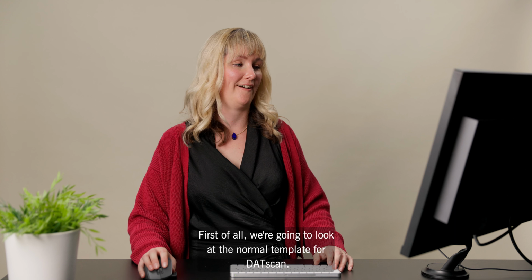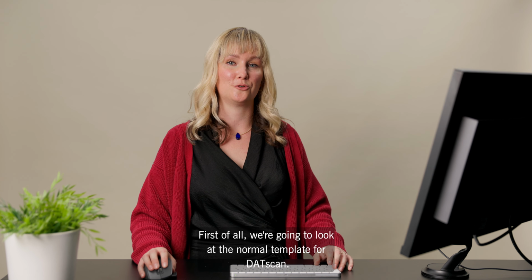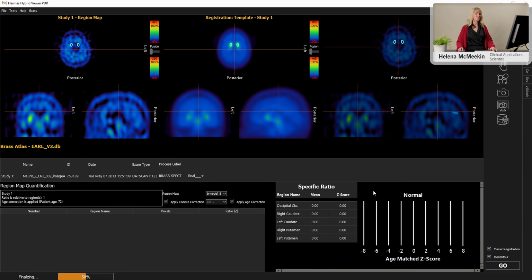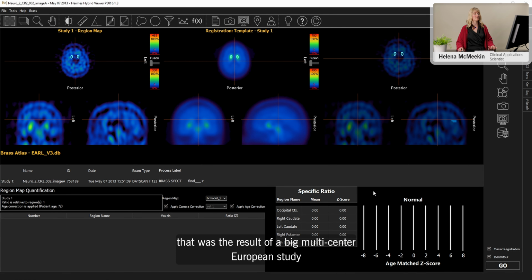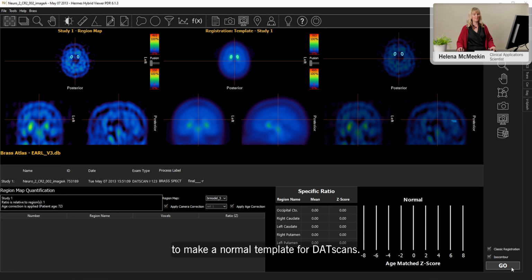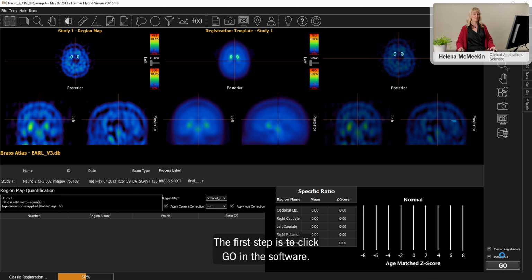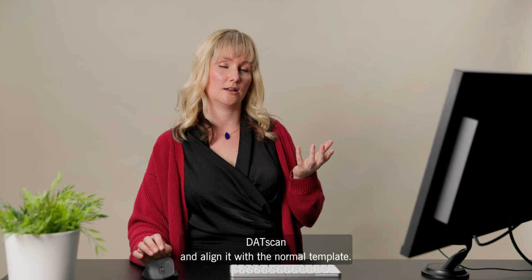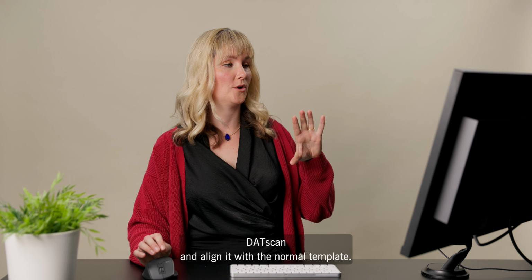First of all, we're going to look at the normal template for DaTscan. This is the EARL template that was the result of a big multi-centre European study to make a normal template for DaTscans. The first step is to click Go in the software, so I just hit that Go button. What it's going to do is take your patient DaTscan and align it with the normal template.